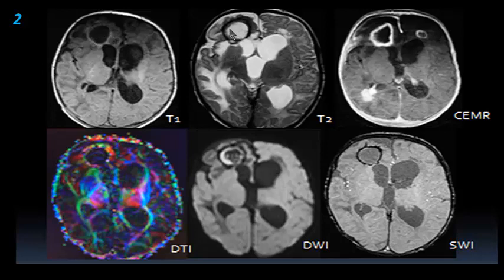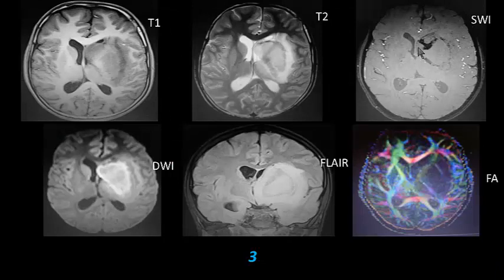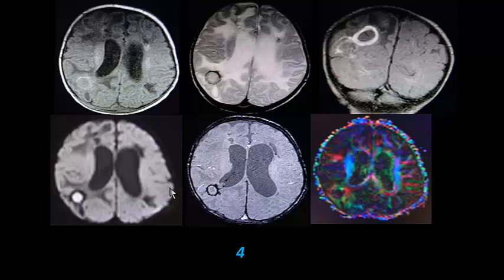Here is the T1 image, T2 center bright, peripherally dark, ring enhancing multiple lesions. On SWI, you see magnetic susceptibility artifacts because of the iron or manganese deposit. And that's the diffusion, which is restricted in the periphery. Another example: similar SWI abnormality or susceptibility artifact, and on diffusion you see the peripheral restriction. Another example of SWI, how nicely it picks up the susceptibility artifact.